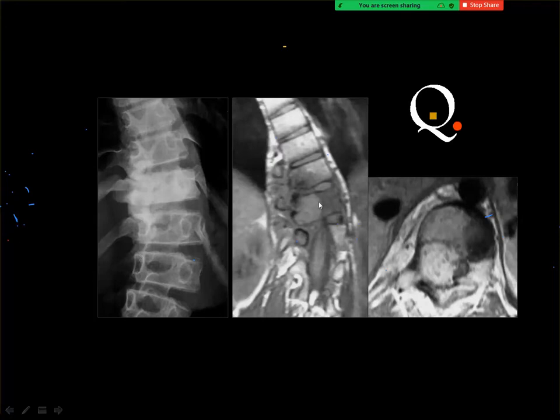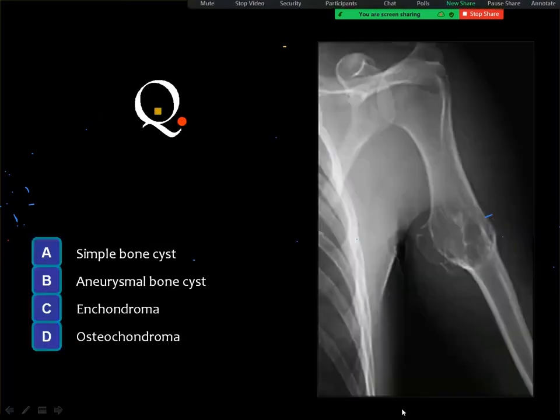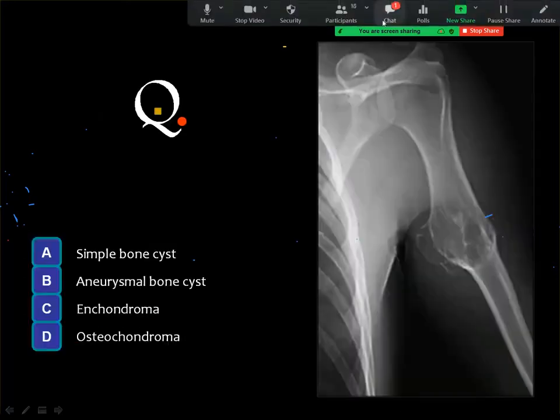And in the MRI, you got this lesion in the pedicle of the vertebra associated with bone marrow edema of the vertebra itself and maybe of the above vertebra as well. Actually, you cannot diagnose osteoblastoma in the skeleton unless it has this classic appearance in the spine of a young person with sclerotic reaction and scoliotic deformity towards the lesion. Next case.